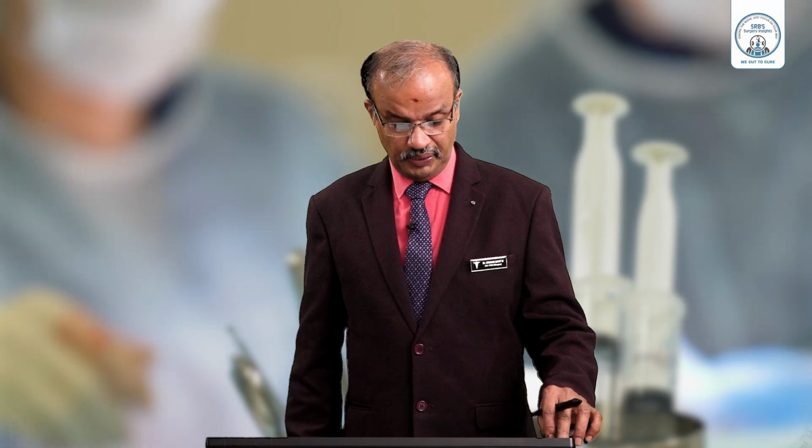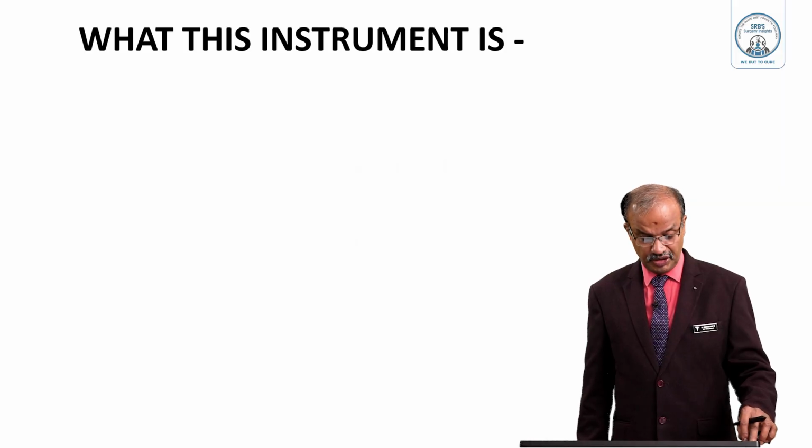Hello students, we'll discuss an instrument which is very commonly used in day-to-day surgical practice in the OP, dressing room, and in casualty, emergency room and so on. So identify what this instrument is.